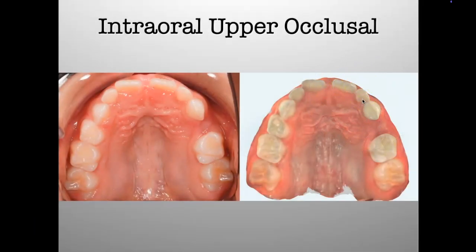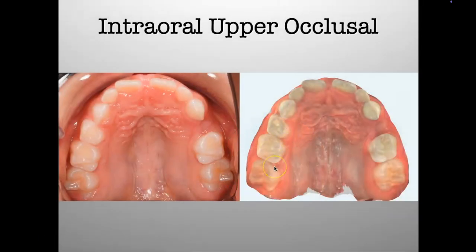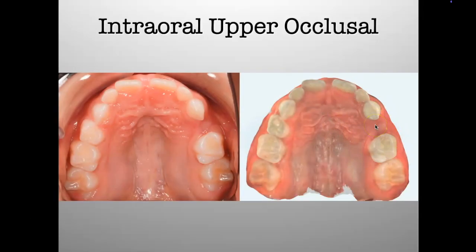Then that would tell us that at least on this side, we're looking pretty good, right? We have from canine to second molar, all those baby teeth are there. And on this side, maybe we're shy a millimeter or so. So definitely not a severely crowded case, right? Very, very minimal crowding. Maybe just a little bit from the space loss, and that's about it.